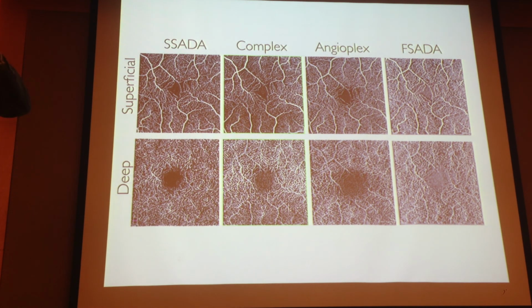The Nidek has a tracking system like the Heidelberg. It can also take 3 minutes. So you have to think that, you're right, it could be just that the quality of the image is deteriorated by a not perfect corneal surface, but it can also be due to the fact that the patients are not able to maintain fixation, so it takes more time, and the quality decreases.